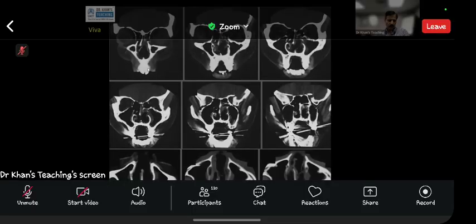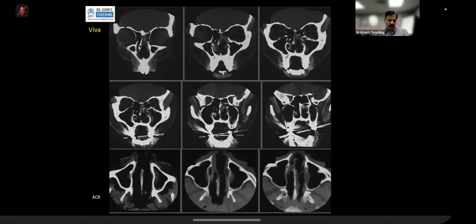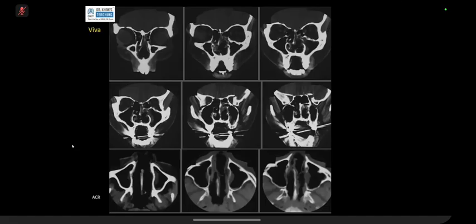Case from the American College of Radiology. Now, just concentrate on the nasal cavity, right? Nasal cavity, and look at these axials. What are your findings, and what is your diagnosis? There is evidence of prior surgery in the paranasal sinuses. There is nasal turbinectomy, upper and middle on the right side, and uncinectomy. Could be a prior sinonasal polyp, chronic sinonasal pathology for which the patient was operated.